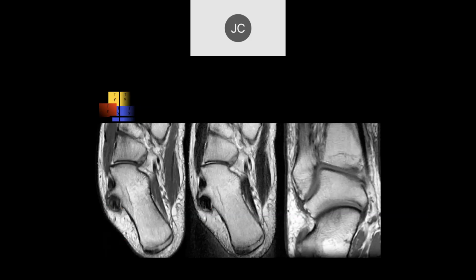Okay, so here we have a kind of large peroneal tubercle with irregularity of the peroneus longus tendon behind it. Right. So this is a typical kind of tendinopathy you get, and it looks like the tendinopathy we see elsewhere in tendons, and typically due to traction and/or abrasion type injuries to the tendon. And this was a symptomatic tendon in this location.